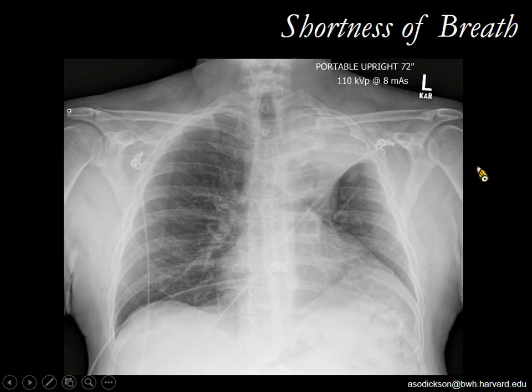But unlike a simple left upper lobe collapse, we have this contour of the lateral margin. This is the so-called S sign of Golden. Normally a left upper lobe collapse would really be flattened like so. But we have this additional bulge here that even our mammographer, I think, recognized from the old X-ray days, right? So here we have this S sign, and what this represents is the lung cancer. This is the mass that is the cause of this left upper lobe collapse.